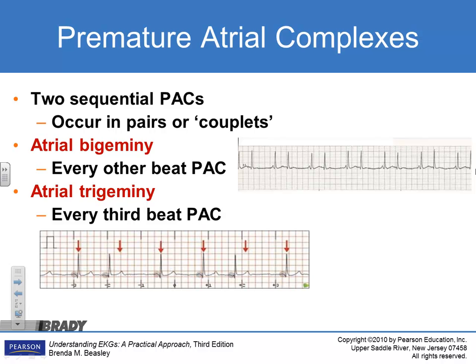With trigeminy, you can see it's every third one. Normal beat, screwed up beat. Normal beat, screwed up beat. Here it is, normal, screwed up. That's right. Normal, screwed up. Does that make sense? Every third one is going to be your PAC.